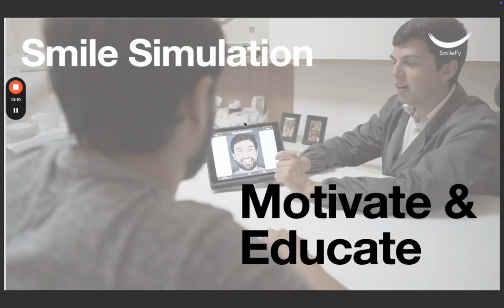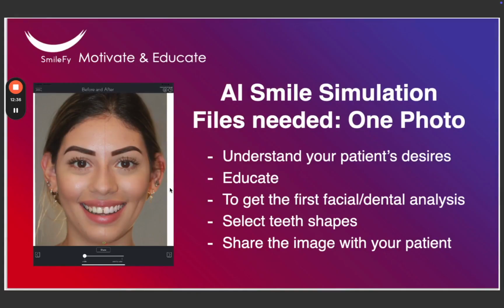Let's start with the smile simulation. When doing the smile simulation, you will need one picture, which is the frontal picture of your patient. You can do the smile simulation at the first appointment to understand your patient desires and educate your patient for the best treatment outcome. In the end, you can share the image with your patient before and after picture side by side and communicate better with the patient.